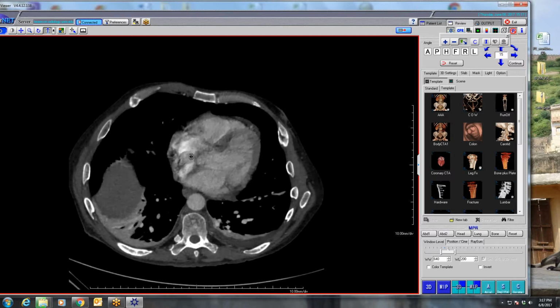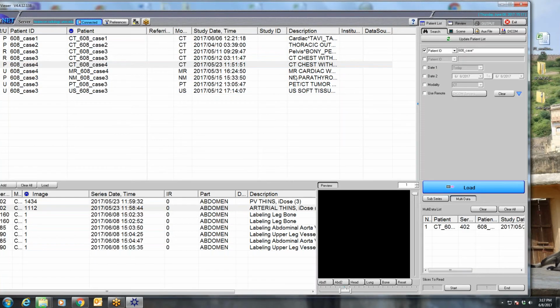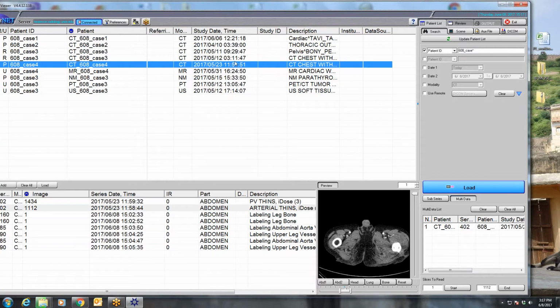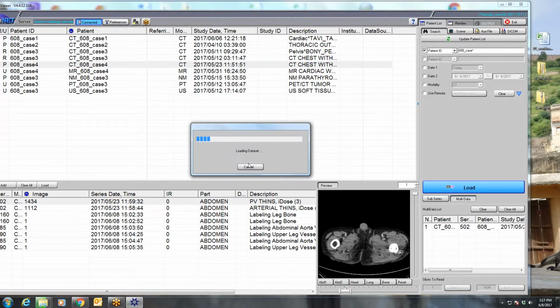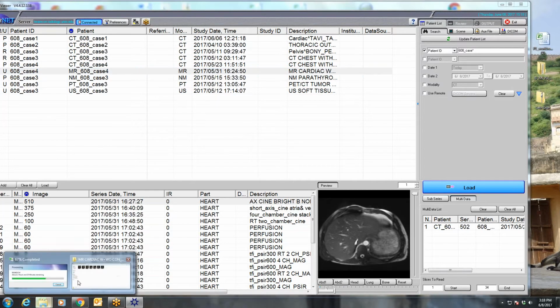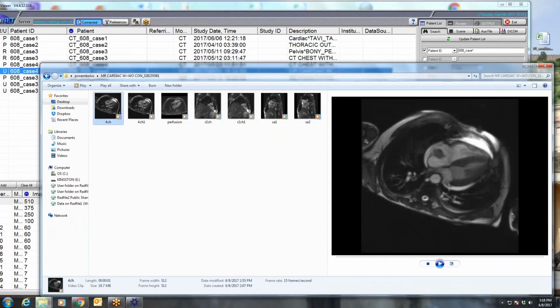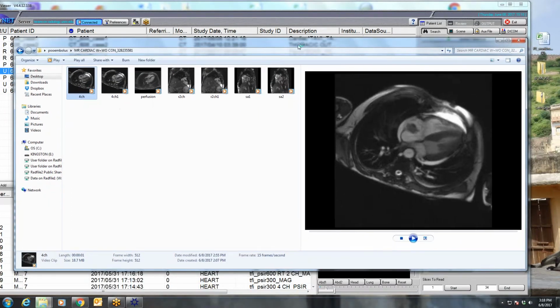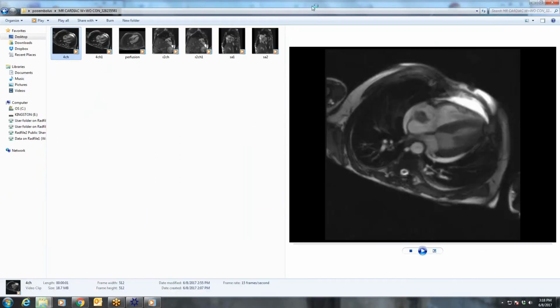And they're like, yeah, we know. He's basically injecting, he has a central venous catheter, and he's injecting fecal material, his own fecal material, into the central venous catheter. We're not really sure why, but he decided to inject himself with his poo. And so this is a fecal embolus, or, well, it's not really a fecal embolus, but it's the bacterial infection from his embolus.